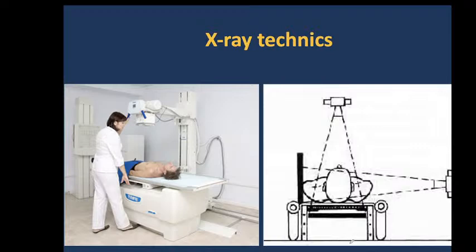X-ray examination is two-dimensional imaging. I hope you understand that it is only an image of a three-dimensional object, associated with the projection layering of various anatomical structures.